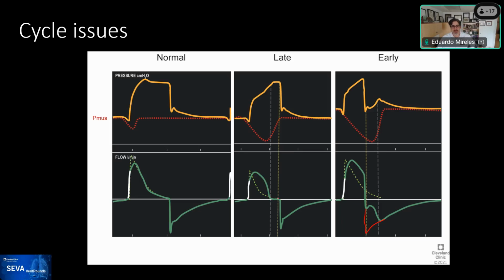And in this example now, as we start learning more, some of you may call this cycling an over assistance, in which the patient just triggered. Technically, this would be a very late cycle, but it's a patient that barely had some effort to trigger the ventilator, and then the ventilator did the rest. And this may be a manifestation of over assistance. Now, in retrospect, I can voice that out. Rob, any comments about this?